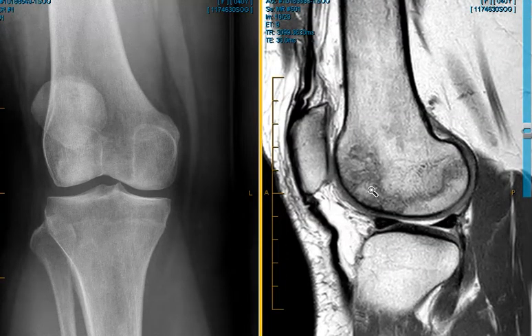This is a side view. We call this a sagittal image where we see the kneecap here. And here is the avascular necrosis hugging the femoral condyle.